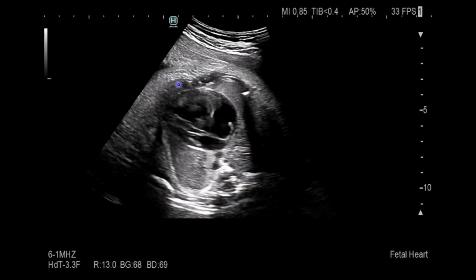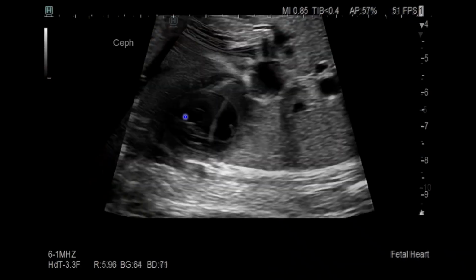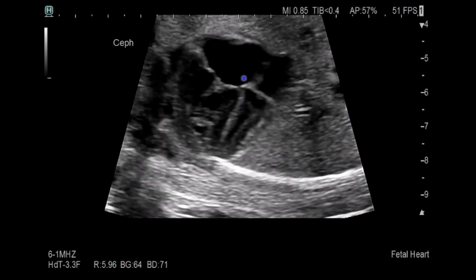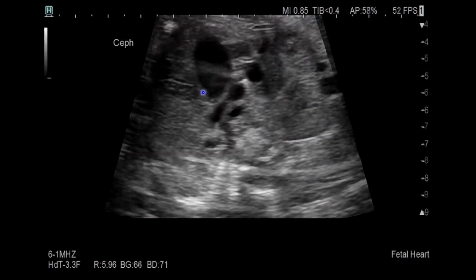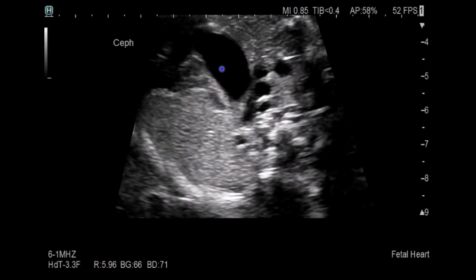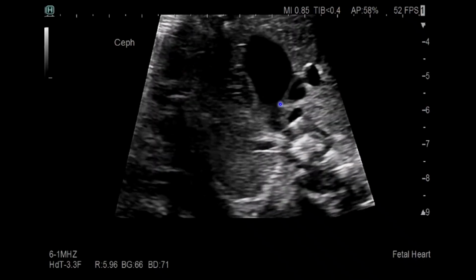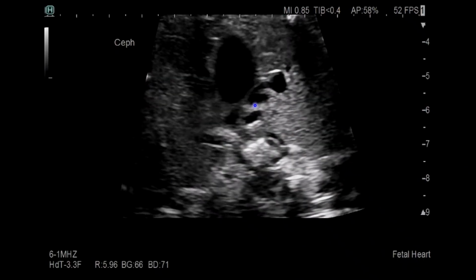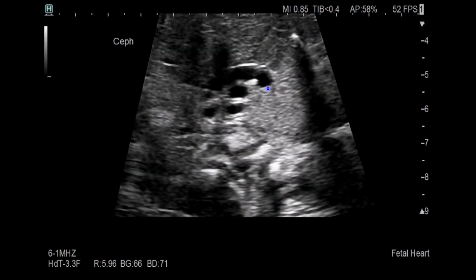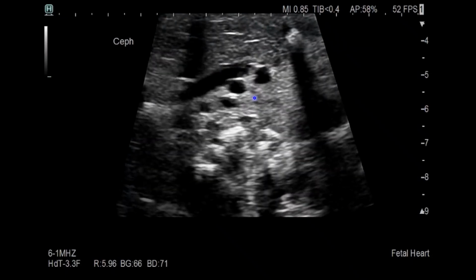Typical four-chamber view and a significant narrowing of the aortic arch and coarctation of the aorta. Here's the apex forming left ventricle that's kind of dwarfed and smashed by this RV here. And we can see in this three-vessel tracheal view, there's the larger pulmonary artery, the ductal arch here. Transverse aortic arch is quite small, and if you compare these vessels, it's really less than a quarter of the size of the main pulmonary artery, even smaller than that. Up in the upper chest, you can see the branching pattern is a typical branching pattern of the aorta.